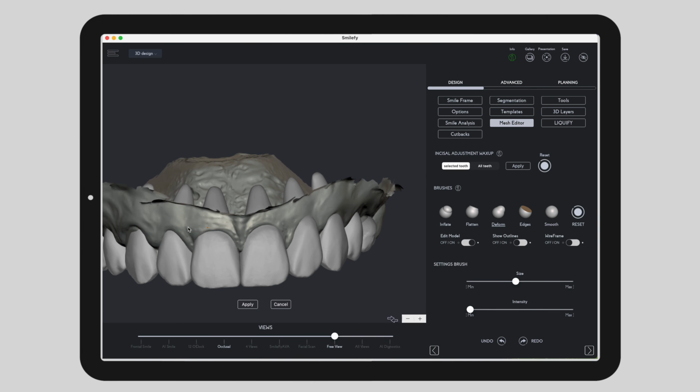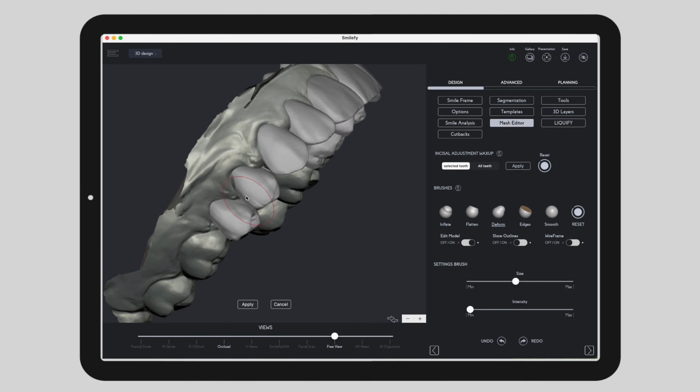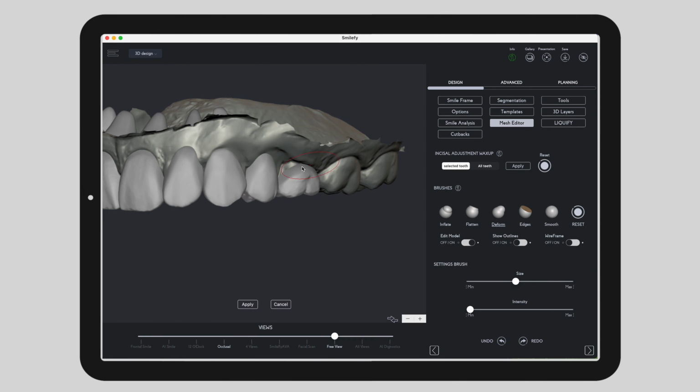Reduce facial surfaces. Adjust incisal edges. Smooth transitions. Shape the teeth to fit the planned 3D smile design. The goal is to ensure that the restorations will seat correctly and the visualized smile will accurately represent the final outcome.